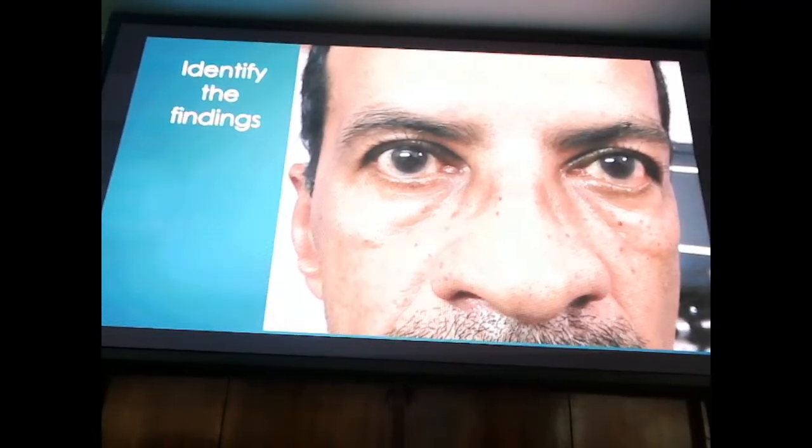And this is how I also decided to do a scan, because endoscopically there is nothing great that I could see. But when I checked his eyes, enophthalmos on which side? Patient's left side. Patient's left. Patient's right or patient's left? Patient's right.